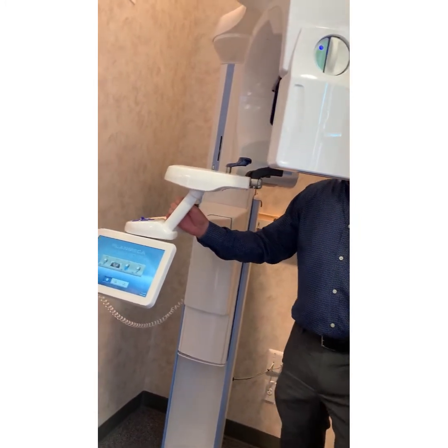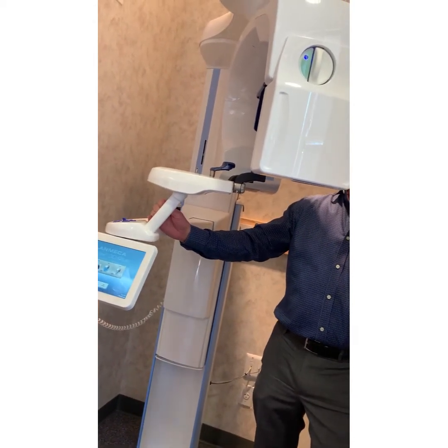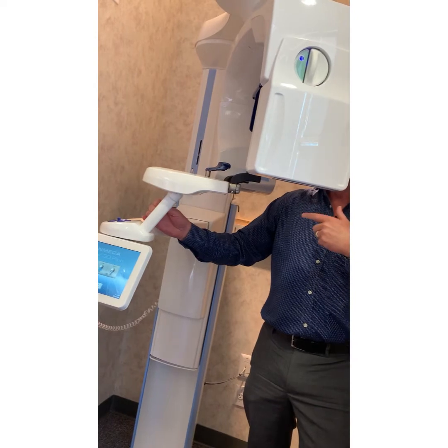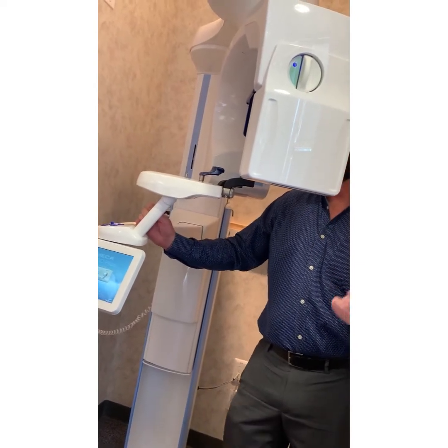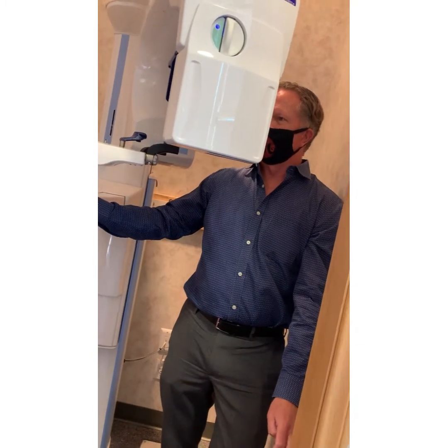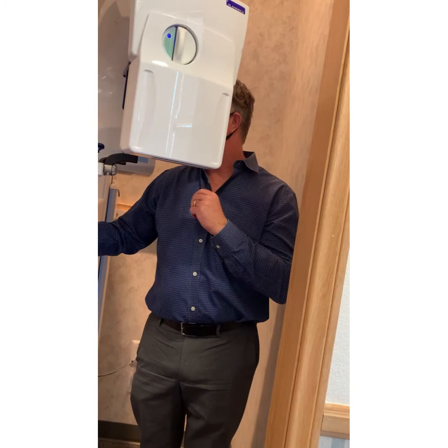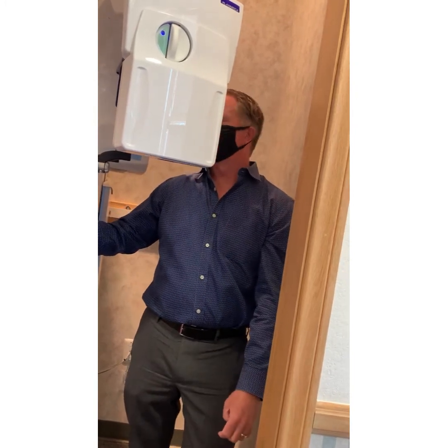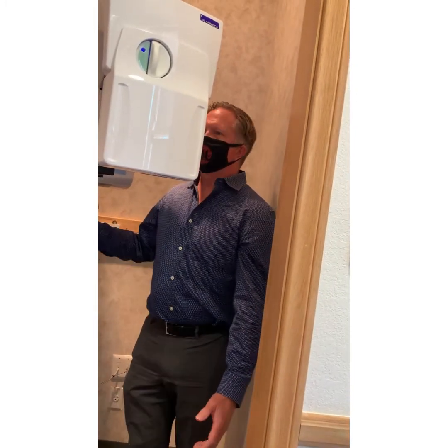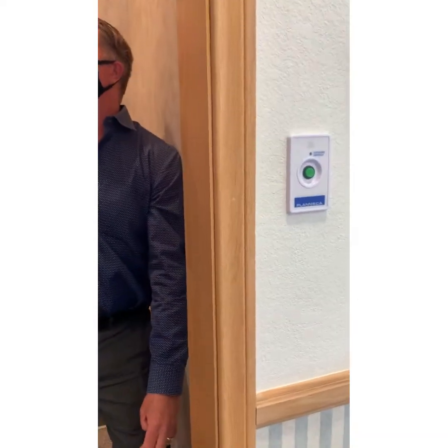Okay, perfect. So we'll turn it off. Whatever is being backed up, more than likely they put the database and your licenses on your server, and that's what's being backed up every night. That's something I would want to make sure with Shine that that's what they did. That's a normal installation. So we'll shut the unit off, and if our computers go into sleep mode, that's okay. When you turn the unit on, it'll sync up and you don't have to restart the computer. I've got offices out there that never turn this off. I'm just telling you what I believe is probably better.